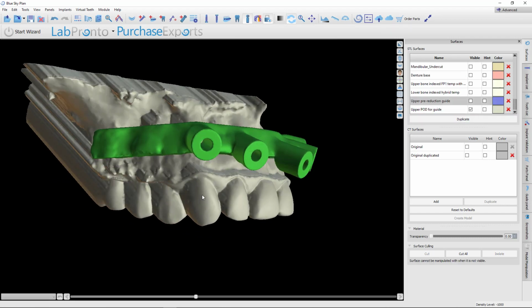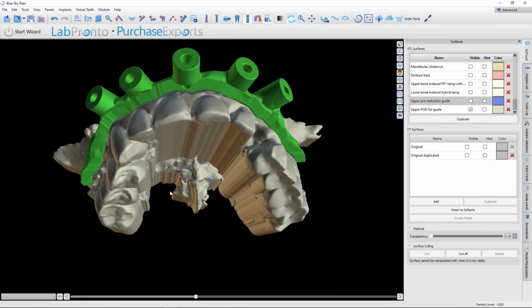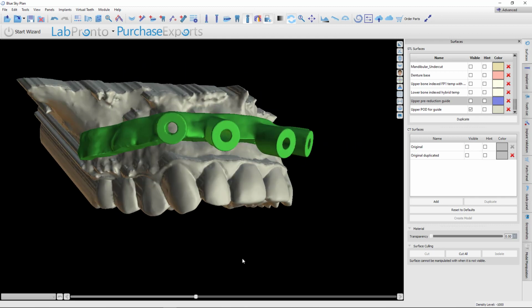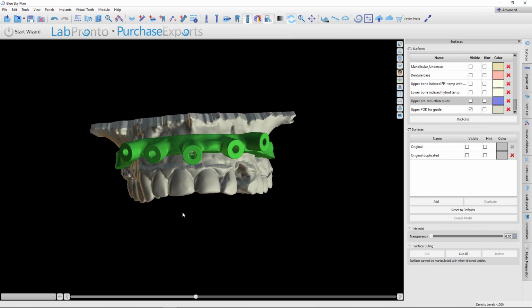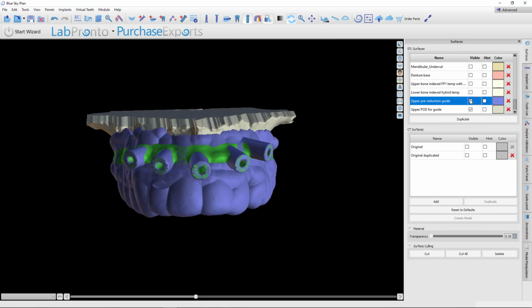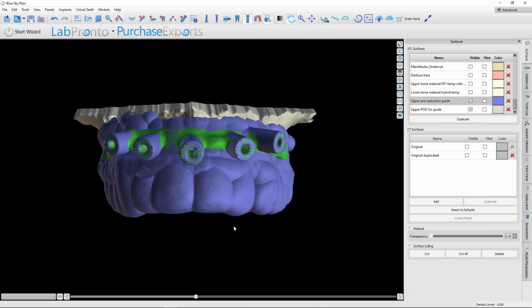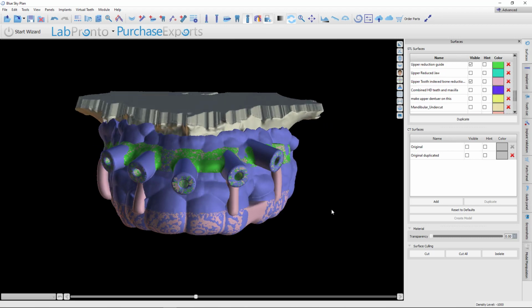So now you can see this is the reduction guide as it would be if it were standalone. And this would go on pin to the buccal bone, and then everything from this flat spot and lower needs to be taken away. The challenge is how do we orient that? It is buccal only. So again, if you look here, this is just this same guide, just cut down somewhat. But the way I've been doing this lately is I can also utilize this to cut off everything above, let's say mid-tooth right here. And so this would be the initial guide.